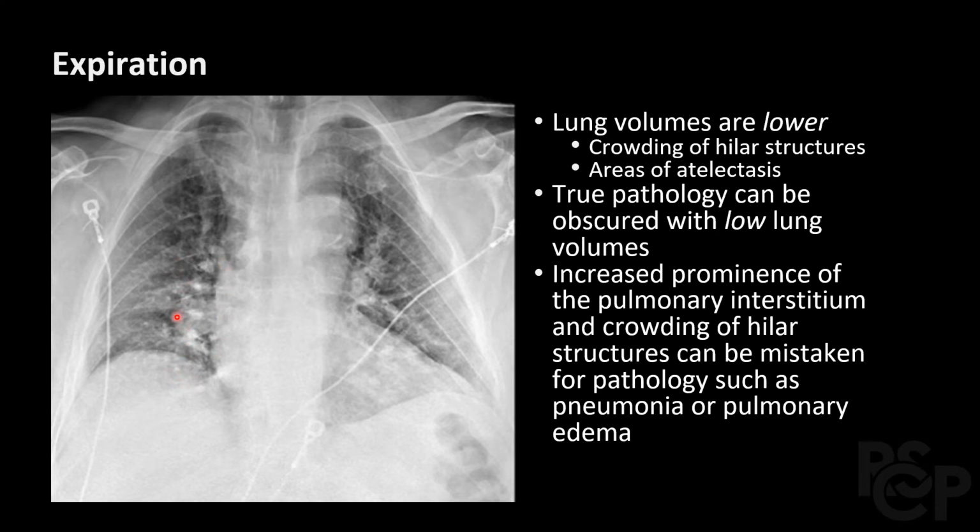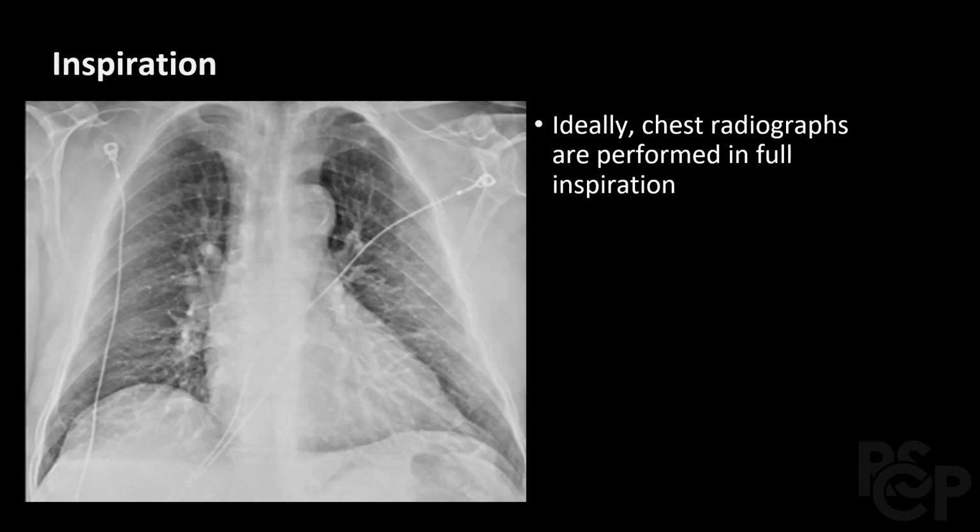hilar structures is present, and we can also notice some areas of atelectasis. These, alongside a prominence of the pulmonary interstitium, can be mistaken for pathology such as pneumonia or pulmonary edema. Therefore, chest radiographs are ideally performed in full inspiration.